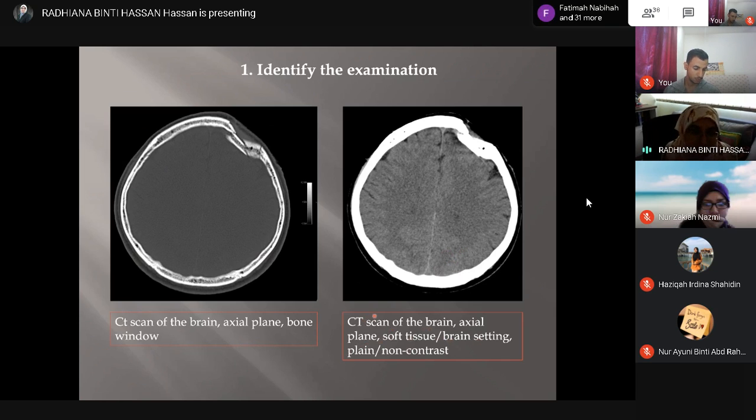So this is non-contrast. So whenever you are given, for example, CT scan brain in soft tissue window, you always describe the findings in the brain. You don't mention the bones because you cannot see them clearly. For example, if you are given bone window only, you describe the bones because if you look here, you cannot actually see anything in the brain. So same thing, if you are given CT thorax, lung window, soft tissue window, certain things are actually not seen.